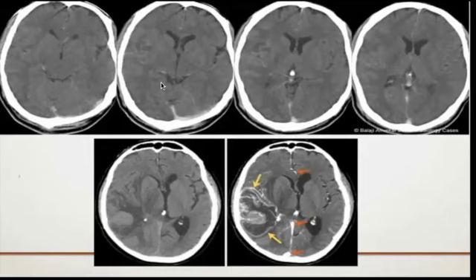So if we're looking at the images above, and if we said that these images have contrast, then I would have said that this white color here and everything abnormal about the images could easily be referred to as just because of the contrast. Now, this whiteness here, the whiteness below here, and these areas of whiteness here, I could have said, okay, this is most probably just normal contrast.